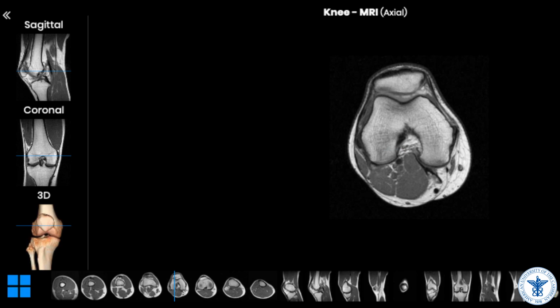Just to remind you, this ligament is an extension of the semimembranosus tendon, which is right here, this hypo-intense line here. This is our tendon of semimembranosus muscle. And the rest of the muscles here on the back of the femur belong to the gastrocnemius muscle, the lateral head here, and the medial head of the gastrocnemius. The short head of the biceps approaches the lateral head of the gastrocnemius, and on the opposite, the medial side here, you can see the termination of the sartorius, this tiny piece of muscle.